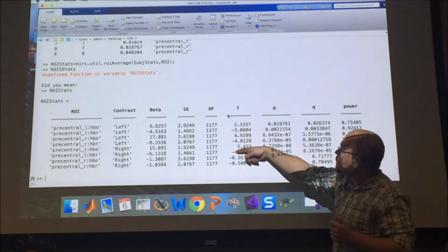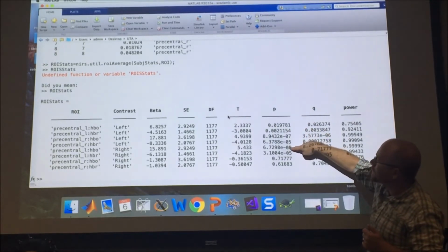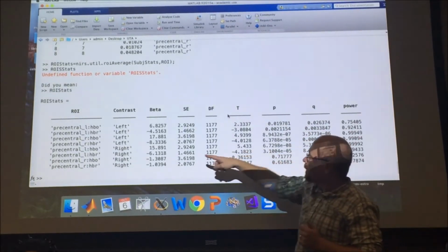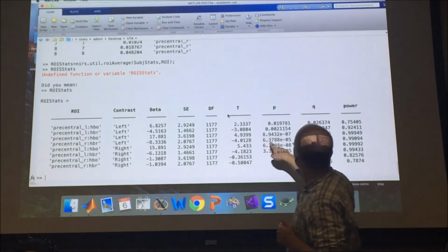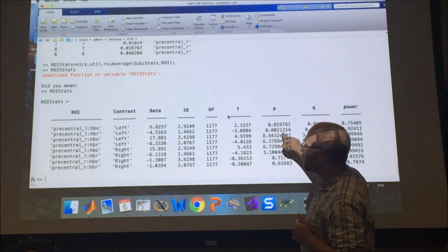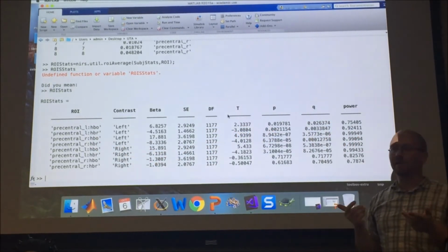This is the statistical, so we see, extremely statistically significant on the left cortex to the right tapping, and hopefully the right cortex to the left tapping. Exactly what we thought we saw.